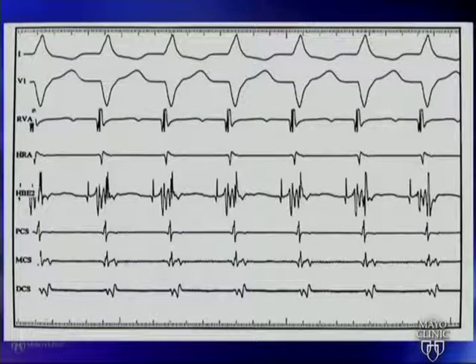First, I would say don't worry about it. But if you're an EP person, you know that the coronary sinus is on the mitral annulus. So because anything that's on the annulus, it's going to pick up both A and V. But remember where the CS drains in, it drains into the atrium. So it's a little closer to the atrium than it is to the ventricle. So you'll see the atrial signals are sharper or more near field, closer to the catheter, and the ventricular signals are a little further away, so look blunter and smaller sometimes, or far field ventricular electrograms.